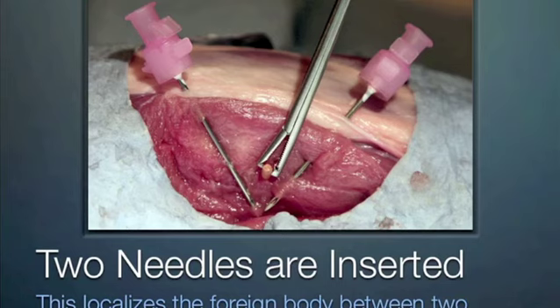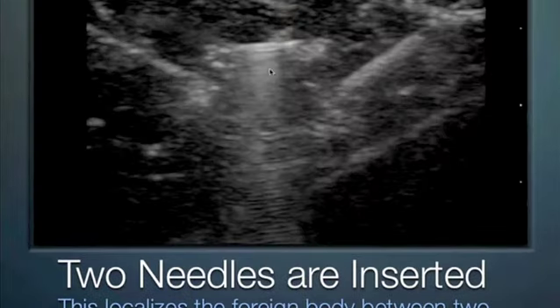We took one needle here coming across, another needle coming here, and this is the actual grasper here with this reverberation artifact grabbing the wooden toothpick. So these 2 needles can localize the location at which to put the grasper.